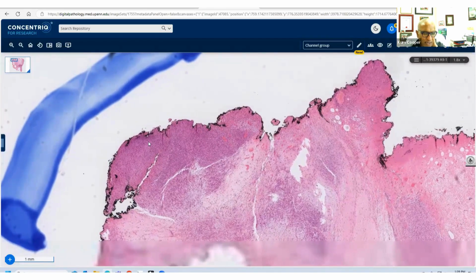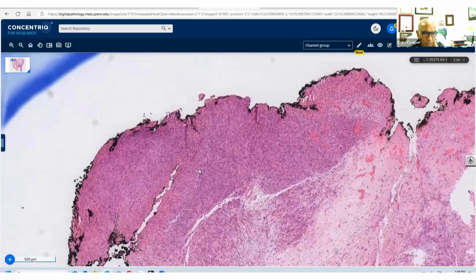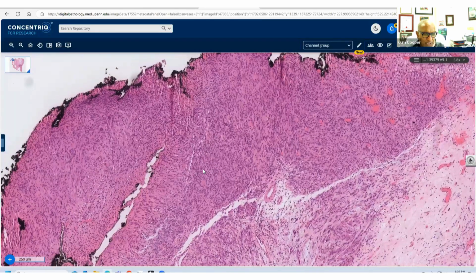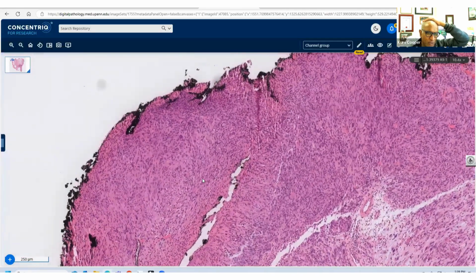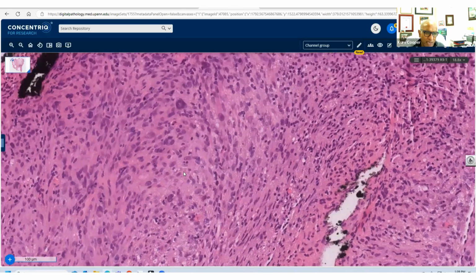And as you can see, we ink everything, and this is pasted with ink. So they had to go back, and there was a resection as well, which had very little tumor, really, and most of it was out. Now, Maria's mentioned some really good differentials, and melanoma certainly has to come into that differential, particularly with those large nuclei, large nucleoli, and very pink cytoplasm.